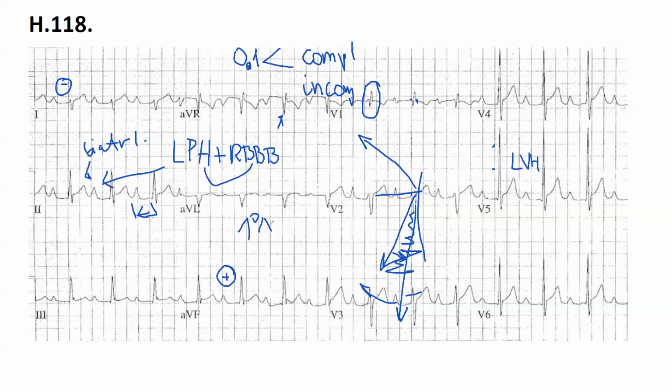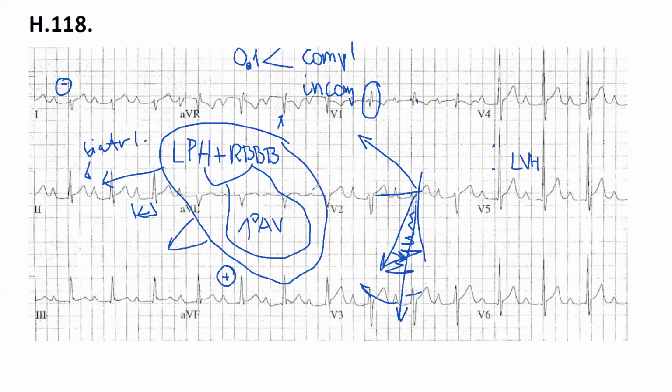So immediately, trifascicular block. And we had left ventricular hypertrophy. Biatrial enlargement, trifascicular block, left ventricular hypertrophy. Thank God we don't have MI, that would be very complete. I don't know if this patient is still alive, but he's not in good shape for sure.